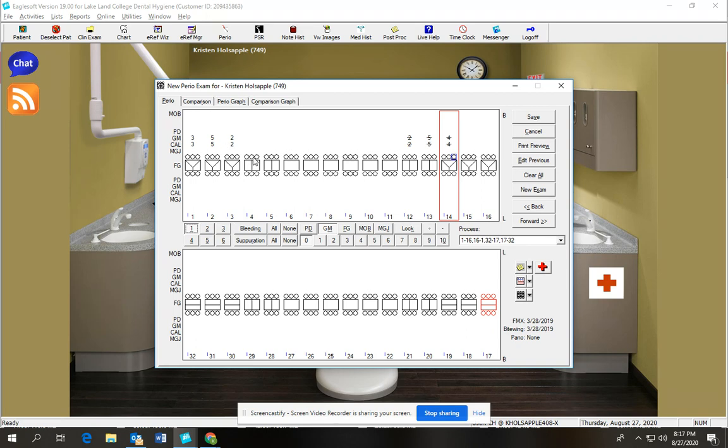All right. So let's say that you went through and did all the gingival margins. This is where you saw recession, and this is where you saw that the pockets had severe gingivitis or overgrowth of gingiva. All right. So now we're going to go to our pocket depth. This is where you probe no matter where you're at. You just take the pocket depth. So we're going to say 3, 4, 3, 3, 4, 3, 3, 4, 3. We're going to come over here to this example, and we're going to say 2, 3, 2, 2, 3, 2, 2, 3, 2.